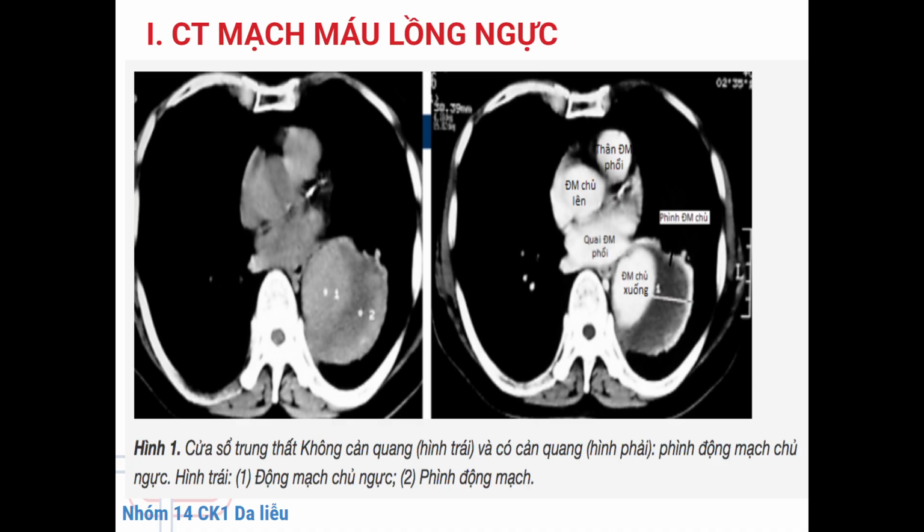In contrast, aortic dissection is defined by the presence of an intimal flap separating true and false lumens. CTA also reveals distinguishing features such as differential contrast enhancement, the beak sign indicating false lumen expansion, and branch vessel involvement, which are critical for Stanford classification.